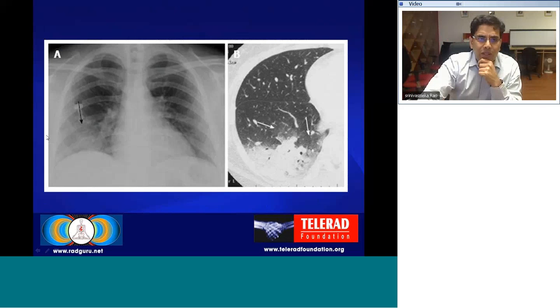It's difficult to make out that it's a Mycoplasma pneumonia on chest radiograph, where usually there is a single lobe involvement, right? And you can see this. You can have associated ground glass opacities, and then some central lobular nodules. If the disease is imaged in the early part of the infection, it probably gives us more clues than as it progresses. As it progresses, it's not very easy to diagnose.